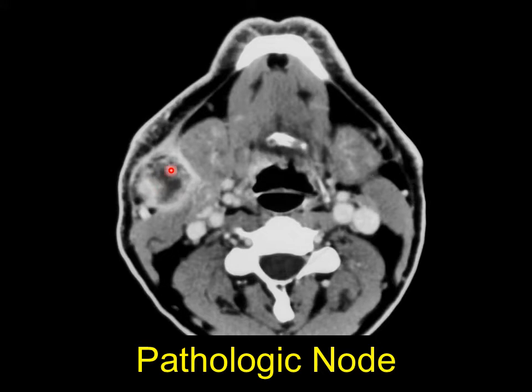Now, when we have a case of a clearly abnormal lymph node, it's not that difficult to tell. Here's a necrotic node, very heterogeneous density, and we see this fuzziness around the outside that's consistent with extracapsular spread and loss of the fat plane here between the submandibular gland and back here between the SCM. That one's pretty obvious. It's when they're smaller that the radiologist's role is very important.